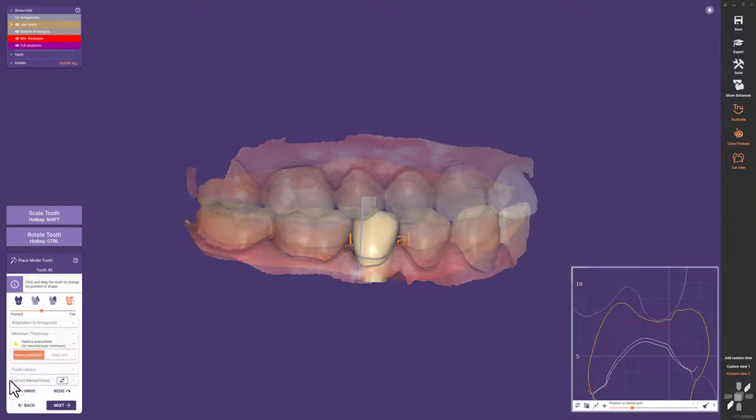Again, the minimum thickness is recalculated, this time all over it. The yellow warning triangles will indicate that the thickness is still within the allowed limits provided by the material configuration. Two additional options with the red warning triangles are only available if the material provider allows it to reduce even below the minimum value. So let's keep option 2.